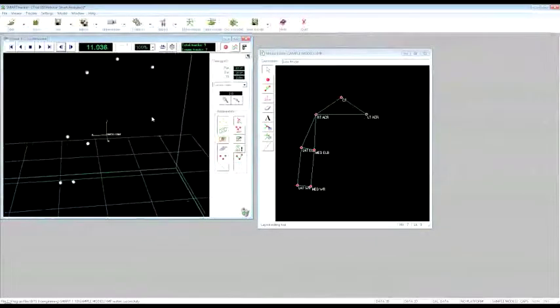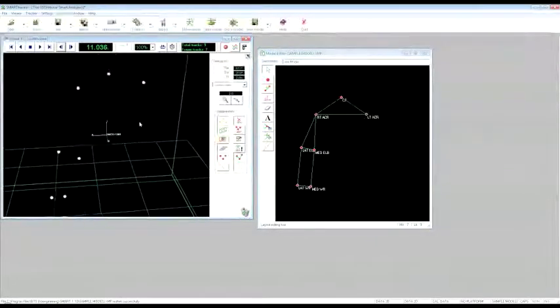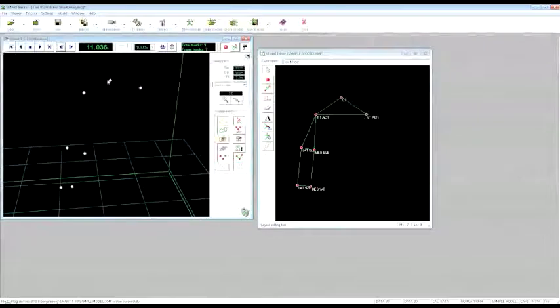start by associating the model to the collected data. So if you want to label each marker, you just have to click on it, and the list of all the available markers will appear.